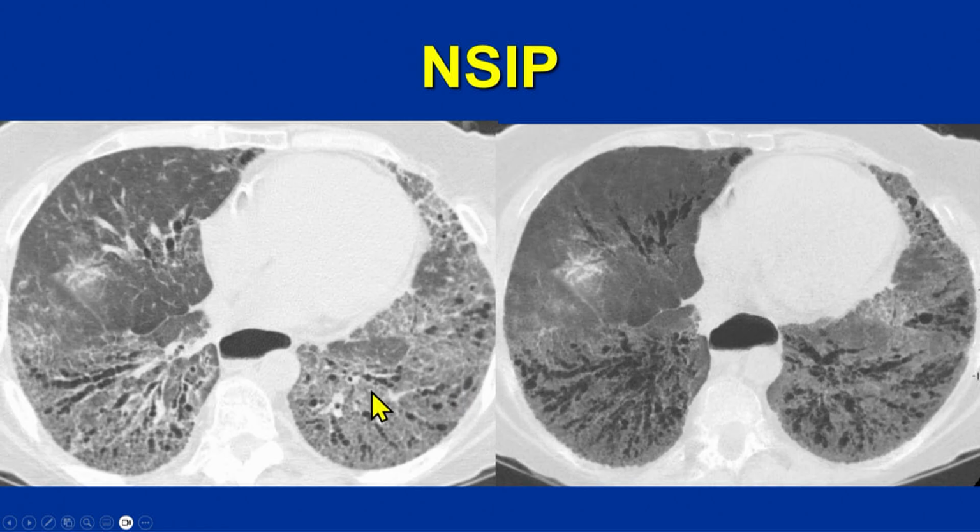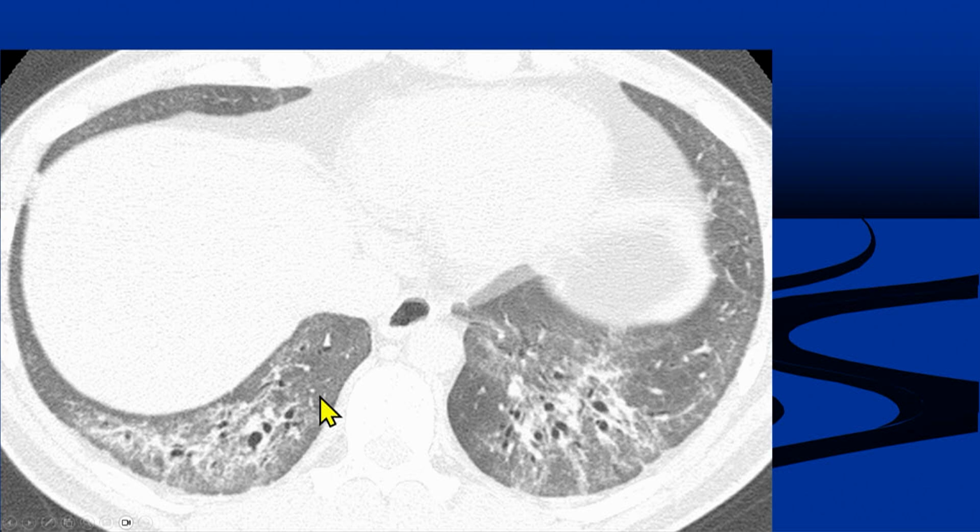And so in addition to the ground glass opacity and reticulation and traction bronchiectasis, we have this massively dilated esophagus with an internal gas fluid level. We know this patient has esophageal dysmotility. They just have to, given the size of that esophagus. And it's a classic example and appearance, a phenotype of systemic sclerosis.